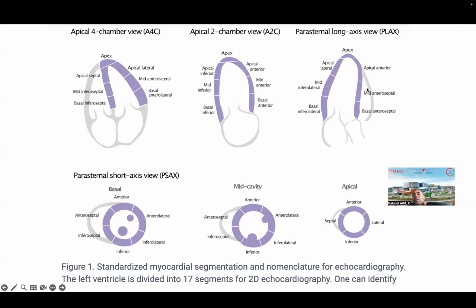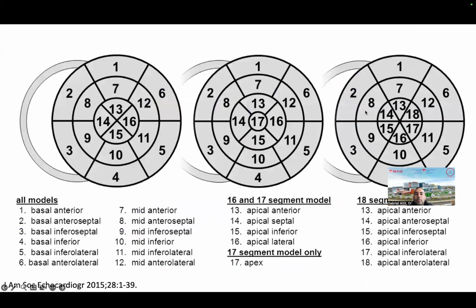So this is more of the septum, and you see a bit of the RV, and this gives out to the LVOT. And when you're looking at the short axis, you're basically cutting the LV at all these levels. So this first level, this second level, and this third level, and sometimes we can get up to the apex. And so that's basically the representation from the view on top of these three views.